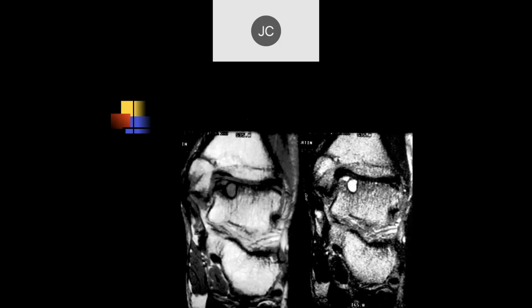Okay, so here in the medial talar dome, I see subchondral cystic change. We don't see the cartilage very well. This is cystic changes. This has a different kind of appearance to the other ones we saw. This is really more of a chronic lesion.